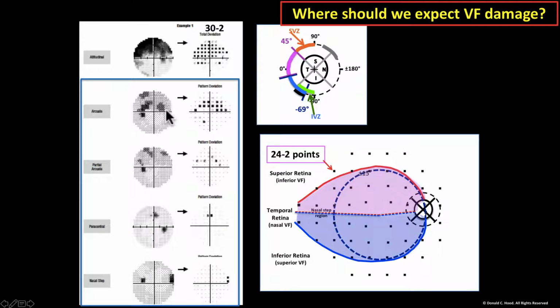So the implication of this combination is that these defects here are all related to damage in this region here and damage in this region here. In fact, in most cases, because this starts up and over 3 degrees, most cases they're related to damage in this region here. That's only 45 or maybe 60 degrees wide.